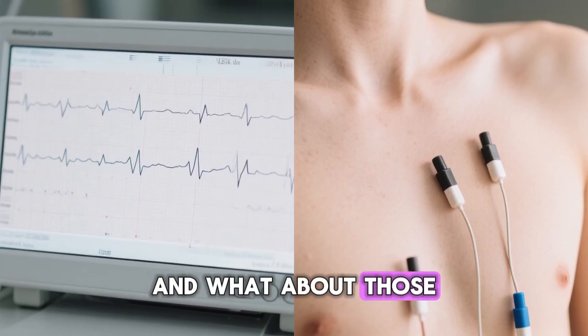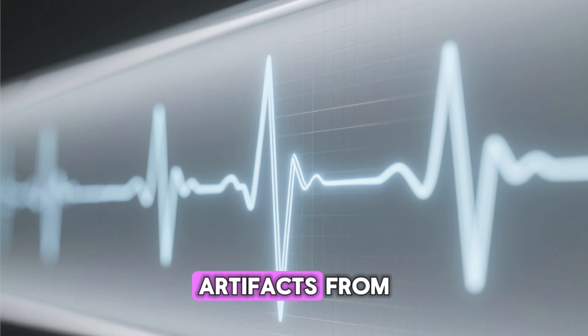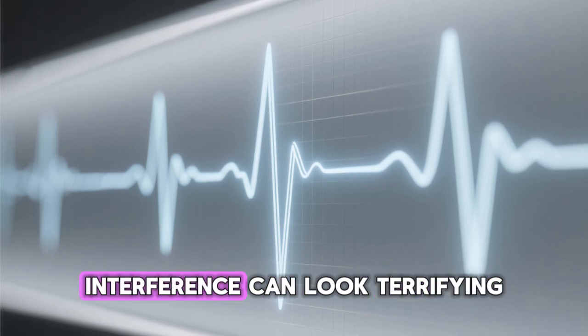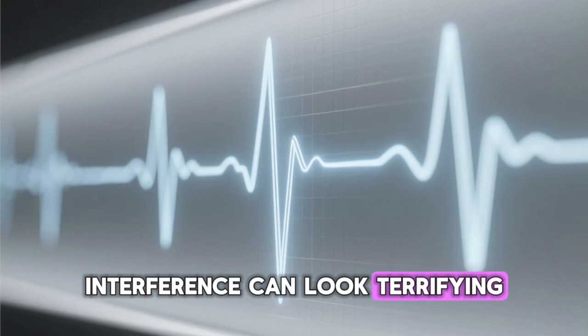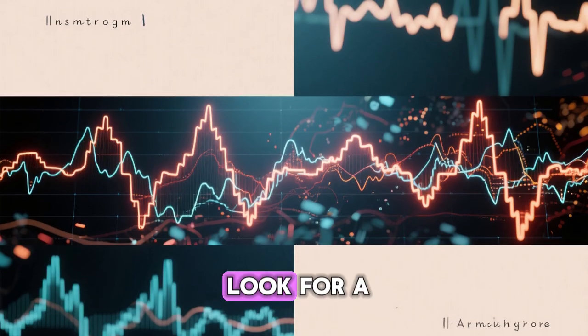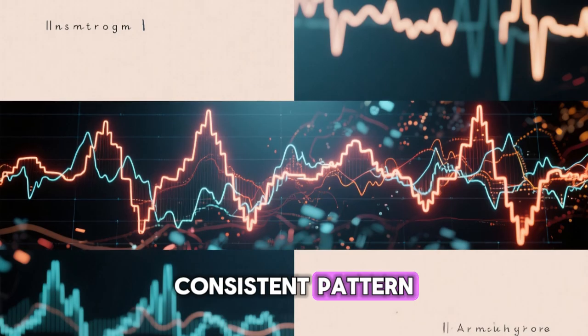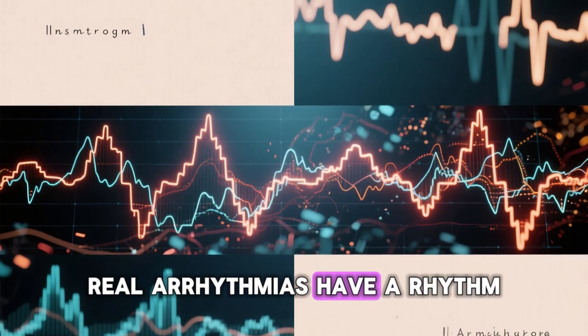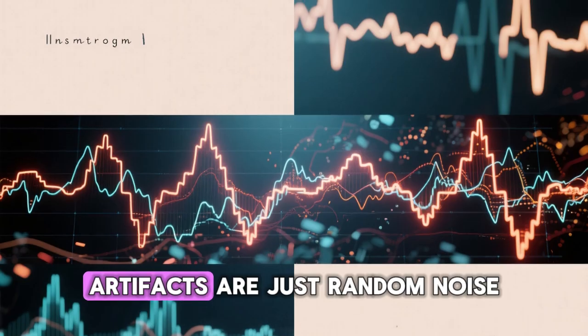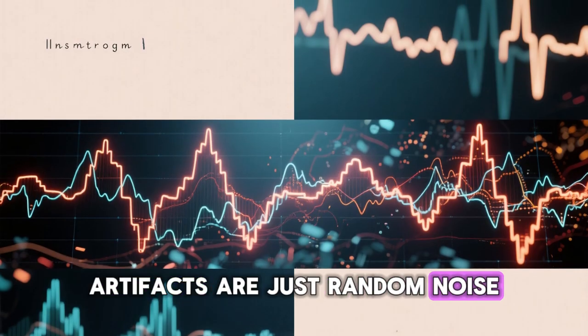And what about those messy lines? Artifacts from patient movement or electrical interference can look terrifying, but they're not a heart rhythm. The key is to look for a consistent pattern. Real arrhythmias have a rhythm, even if it's chaotic. Artifacts are just random noise.